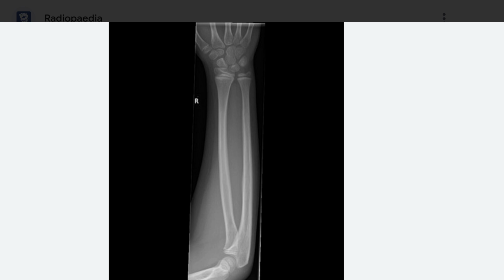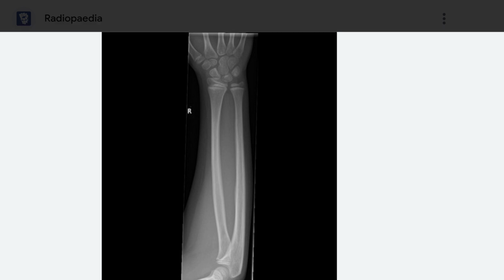Mention the anteroposterior AP view or lateral view, followed by region observed, pelvis, cervical spine, thigh, etc., on radiograph, along with side if not axial, followed by age and gender of patient if known.